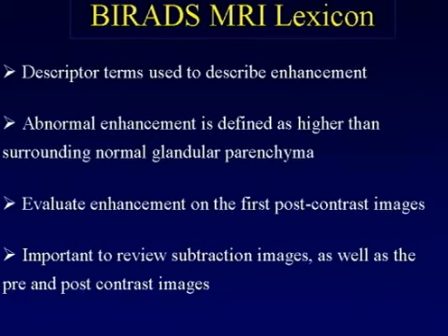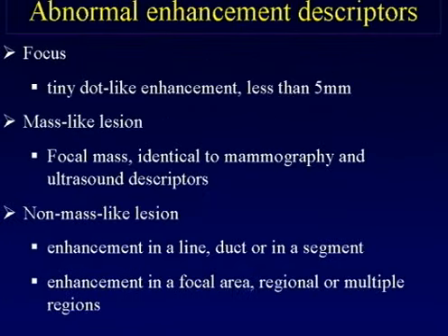That's all we're looking for. And you want to look at this enhancement ideally on the first post-contrast scan. And then if you do see a lesion that appears bright, you're going to go ahead and review everything, the subtraction images as well as the pre and post-contrast images.